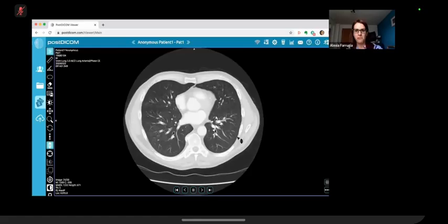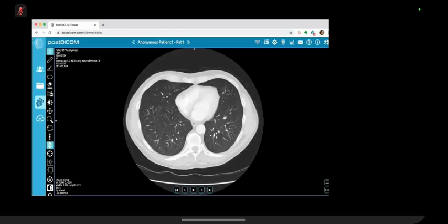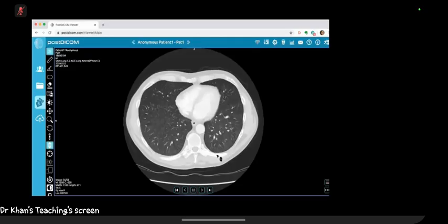So what other additional features would you look for? I don't see any pleural effusion. I'll look at soft tissue windows, but I don't think there's any obvious lymphadenopathy. I don't see any volume loss or lung collapse. I think this is a very florid picture bilaterally, so it's probably something which is affecting the whole lung. Some inflammatory process, possibly a pneumonitis again.